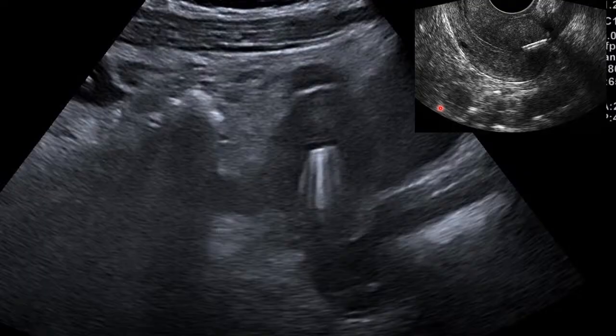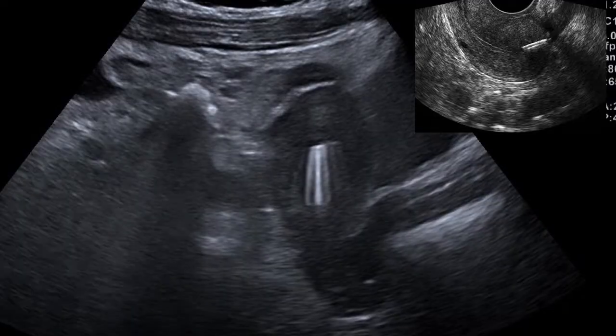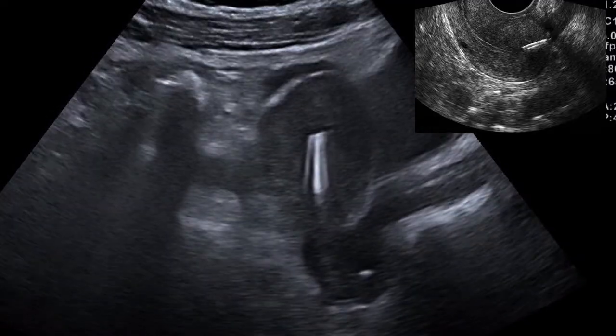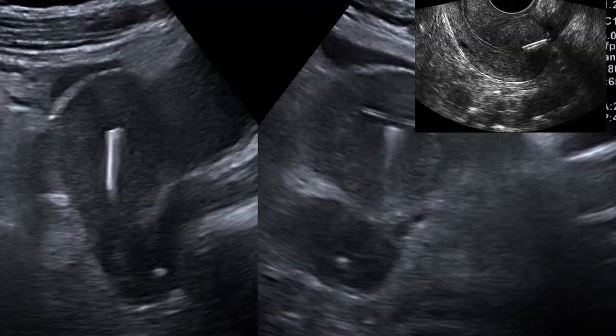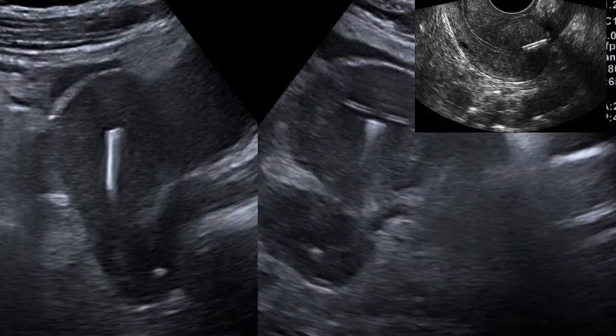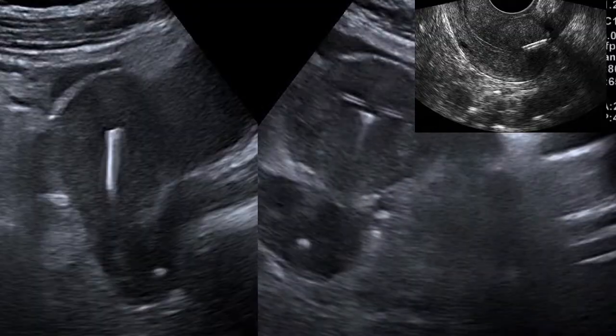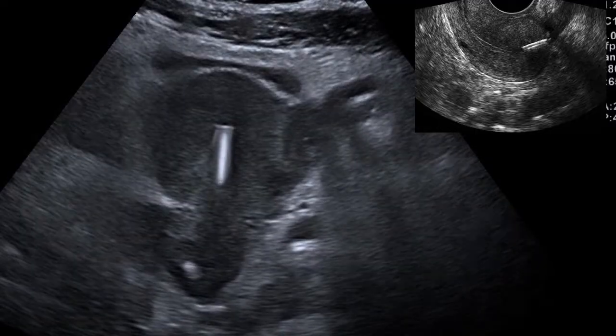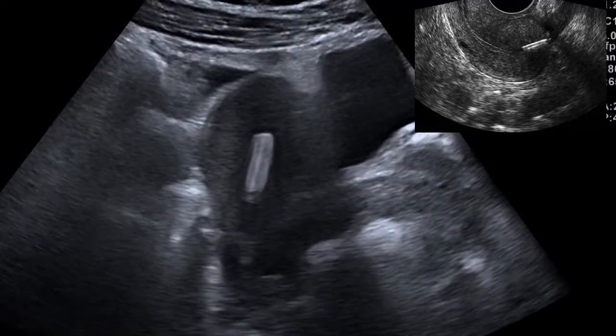In this presentation, I need you to understand the role of ultrasound in evaluating patients with pelvic pain and an IUCD. You should be in a position to recognize the normal sonographic appearance of an intrauterine contraceptive device, and also differentiate IUCD-related complications from unrelated pelvic pathology. You must also appreciate the importance of avoiding diagnostic bias, so you don't just rush into conclusions.